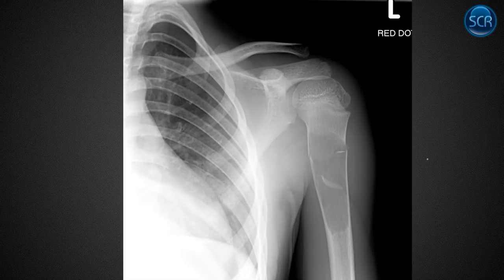So now getting into actual tumors, the most common thing you're going to probably see on boards show up in the shoulder as far as a neoplasm goes is a simple bone cyst. And I guess this isn't technically a true neoplasm, but it's thought of like a neoplasm. It causes a big empty cavity here in the bone, usually filled with serous or sanguinous or serosanguinous fluid. And these often present with pathologic fracture because you can see how thinned out the cortex is.